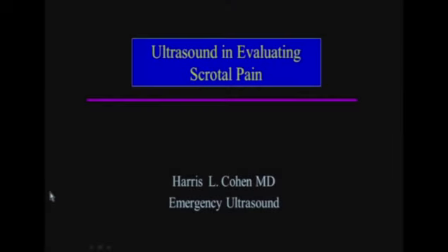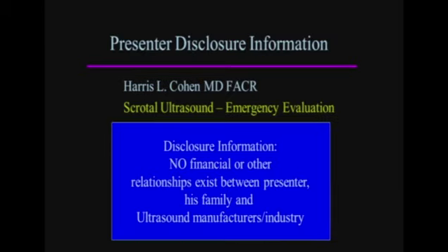This is a lecture on ultrasound and the evaluation of scrotal pain with a particular perspective on the child and the adolescent. It's a case-based lecture, so it'll be based on several example cases in order to get us the information we should know about in evaluating the scrotum of these patients.